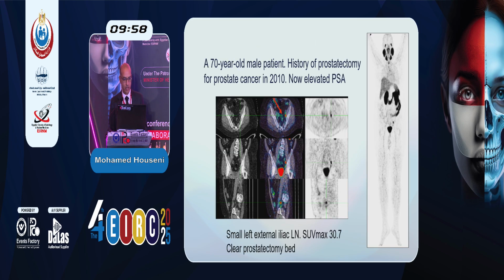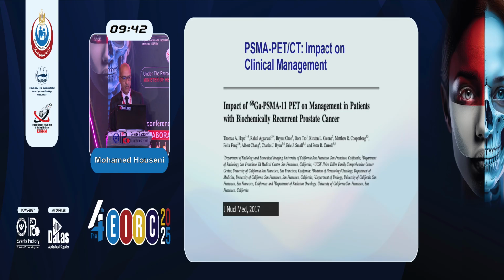And in this patient, a 70-year-old male patient with a history of prostatectomy and now elevated PSA level, we can see the small active lymph nodes in the left external iliac by having the PSMA PET-CT. The PSMA PET-CT also will affect the clinical management, as in this paper.